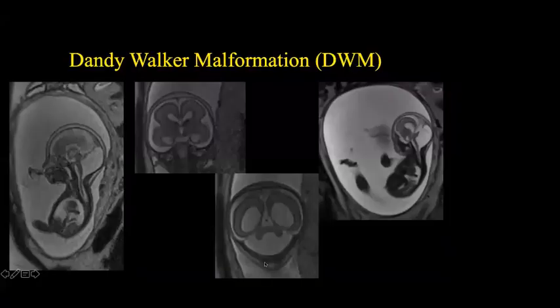Okay, good job. Okay, so this is a fetal MRI, and by the end of the lecture, you guys tell me if you are doing fetal MRI in Iraq. I don't know, I'm not there. So it's a case of Dandy Walker malformation. You see a large posterior fossa and hypoplasia or almost absence of the vermis, keyhole appearance, and then hydrocephalus.